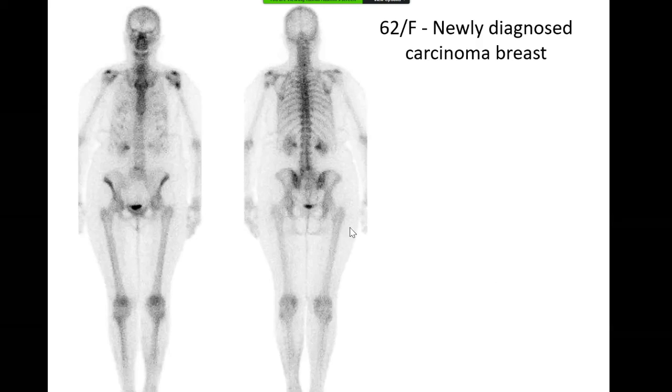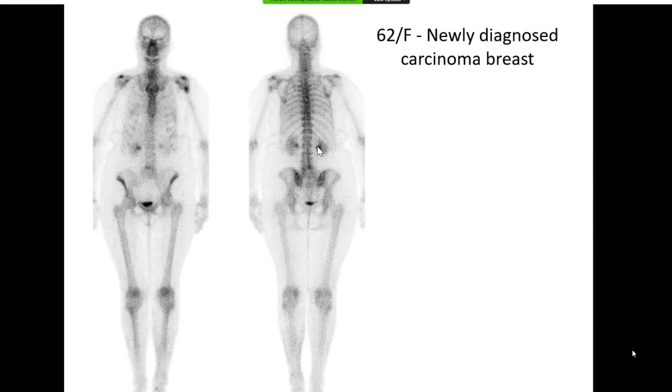Very nice interpretation. Again, you rightly pointed out some of the features which basically fall within the realm of normality or normal variation. So a bit of uptake at the pelviureteric junction of the renal pelvis could be just a dilated renal pelvis, a bit of a hold up, normal, don't worry about it, even if they are asymmetric. Of course, if you have some previous imaging, you can look at the ultrasound or CT scan to see if there is any pathology. But generally, renal pelvic uptake is considered normal.